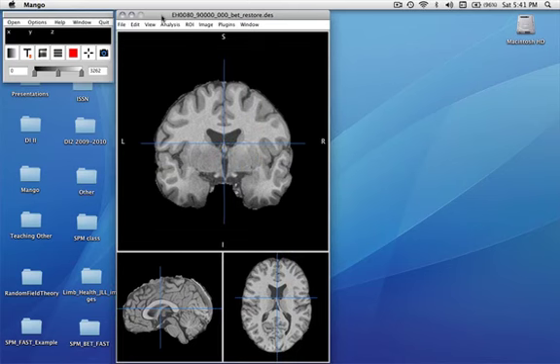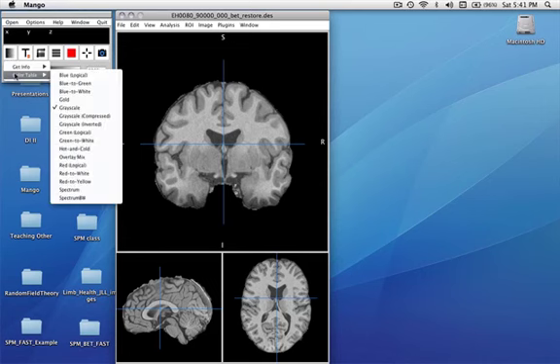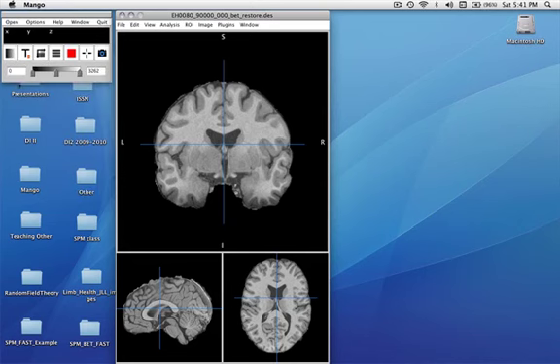So this shows us how to navigate through a 3D image file. If we want to change the way it looks, that's done in the main window up here, and presently we're displaying it using a color table that's called a grayscale. We can change to a variety of other color tables. We won't do that for this image. But there are 3 handles that we can adjust.